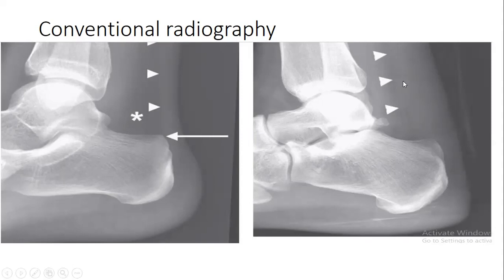So this is pathology, and this is the normal Achilles tendon, which is not enlarged.